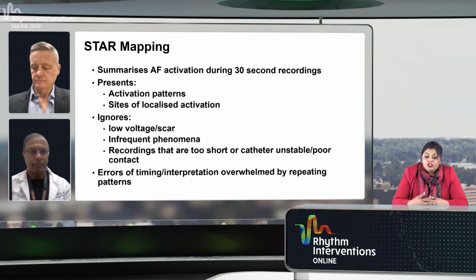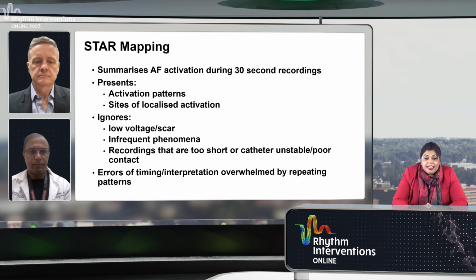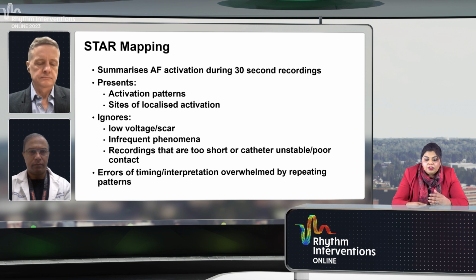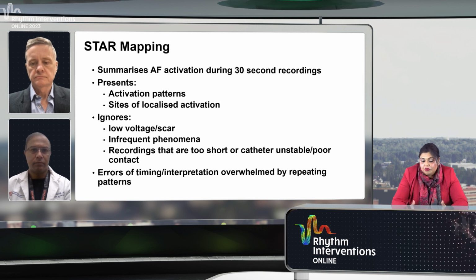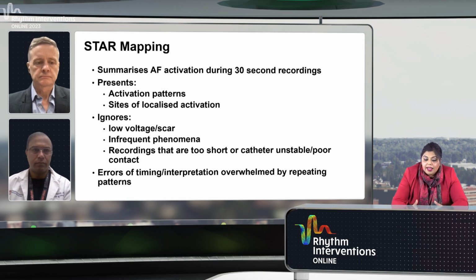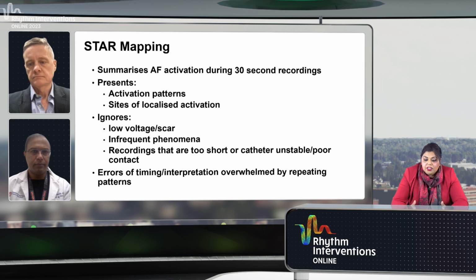It can show you activation patterns. It can show you sites of localized activation. And while it does this, what does it ignore? It ignores low voltage and scar. It ignores infrequent phenomena, and recordings that are too short or where the catheter is unstable or has poor contact. And errors of timing interpretation are overwhelmed by repeating patterns.